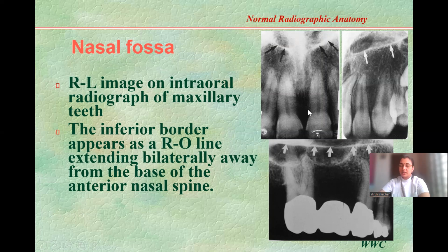Again, we're going to just close our eyes and think. What did we talk about here? हम उसके border define करने की कोशिश कर रहे हैं, okay? कि nasal cavity उसका border कहाँ है, okay? Instead of just mugging what is written here, the inferior border, it's not like that. Just close your eyes, think. We have a triangular black center nose. It will be lined by bone over here.